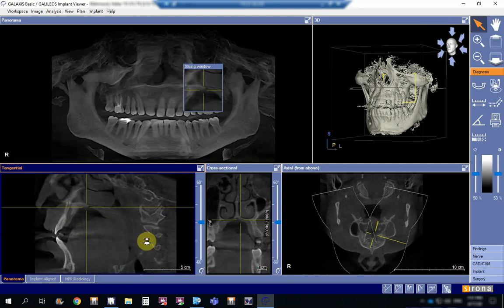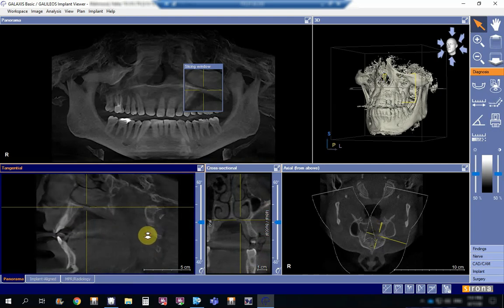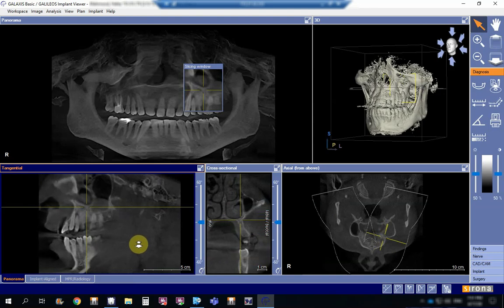Of course, this is the atlas and the cervical vertebrae. If I go in a lateral direction, again I'm moving laterally. I skipped. Now I'm still in the palate. See, compare always. If you don't know where you are, you go and have a look at the coronal or the axial views, and then you go more laterally. Now you have reached the level of bone, as you can see in here.